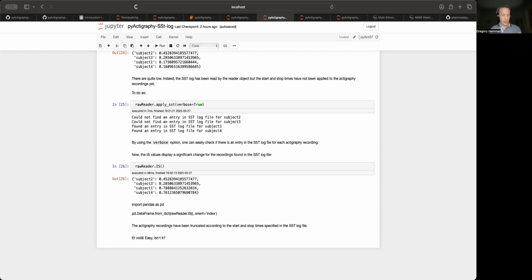If you never do this, it means that the average is not representative of any day, which is the case of white noise, and you have an IS of 0, which is not physiological, but it's just to tell you the two boundaries of the IS. So this is what it does, actually. Okay, I hope I answered the question.